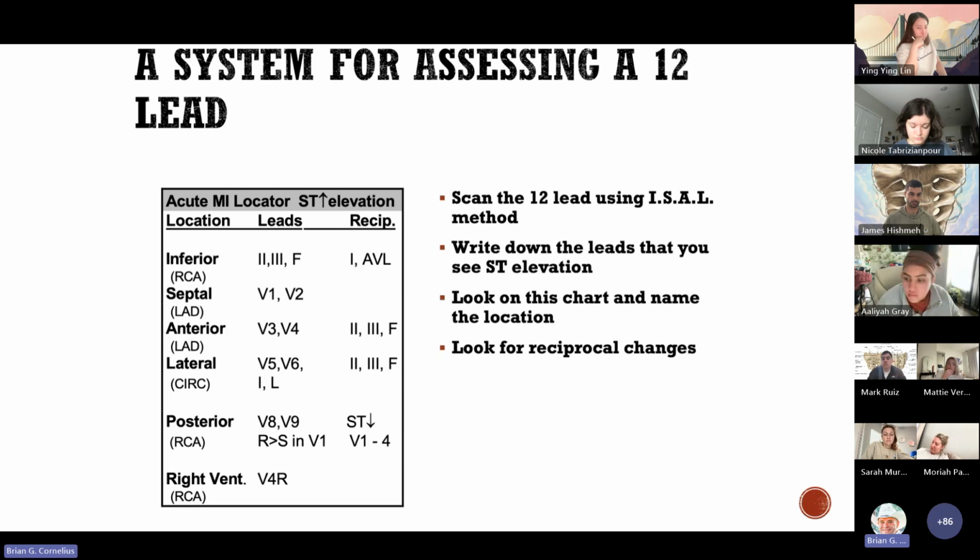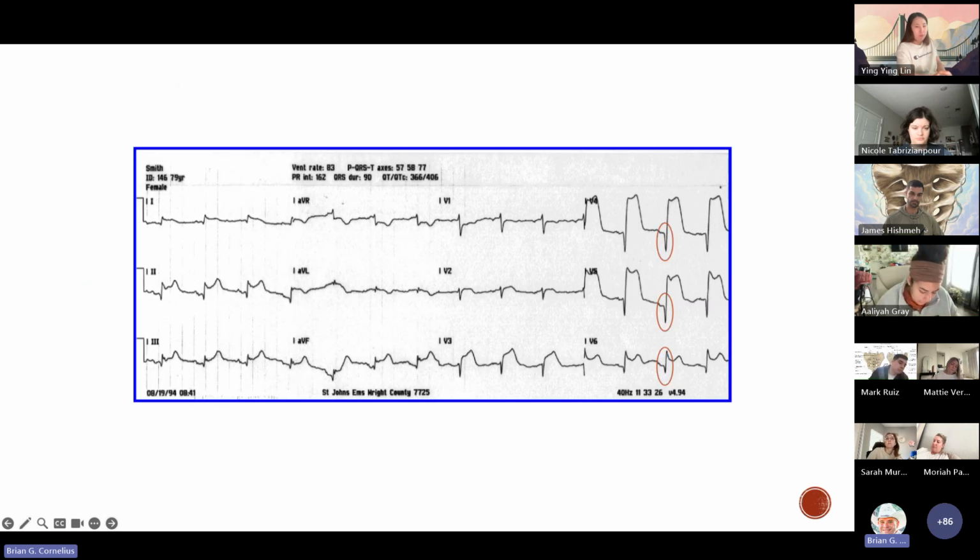Paul asked if there would be EKG picture questions, and the answer is lots of them. So you will have 12 leads, you will have just rhythm strips, and it may be a scenario like you have a patient that presents with chest pain and these vital signs and this EKG, what's your diagnosis? Or ACLS type stuff, same kind of thing. Sarah asked about the boot, so I'm going to hop over and look at a 12 lead real quick and walk you guys through it.